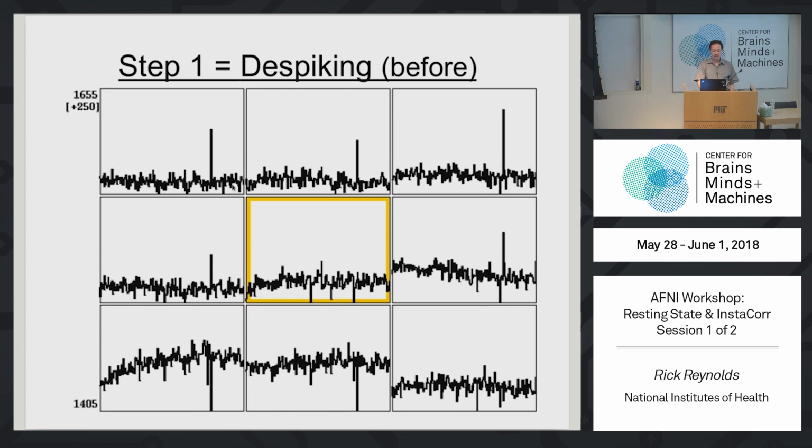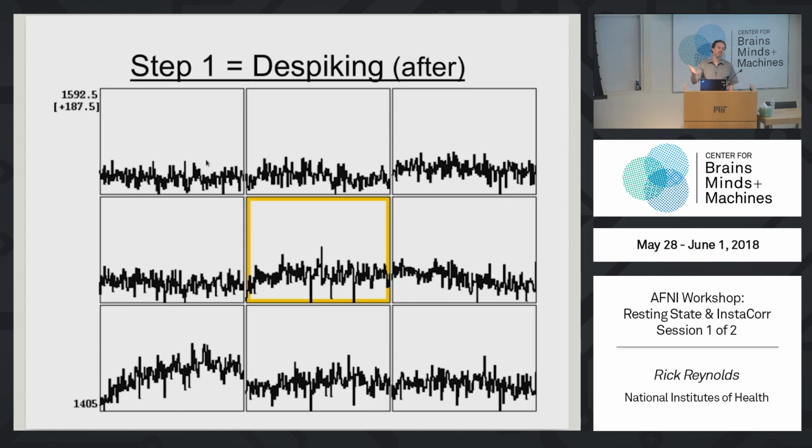Are these big? So that's a big motion spike. Is it useful to have that in the data, or would you like to hammer it down? It's hard to say. Some people think the spike should be in there for doing registration, but rarely is that really helpful because we've got interpolation, we're in the middle of voxels. Registration is not going to just clean those spikes out, as we've seen.